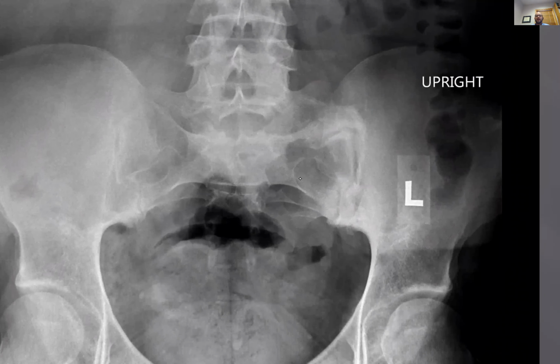Okay, so now I think this is a great case. And we talked about this, but gosh, I think this is important. The rheumatologist believes that this is going to be either osteitis condensans ilii or a seronegative spondyloarthropathy related to either psoriatic or Reiter's disease or atypical AS. I don't buy it. Why don't I buy it? It's faulty biomechanics, just putting more strain on the SI joint.